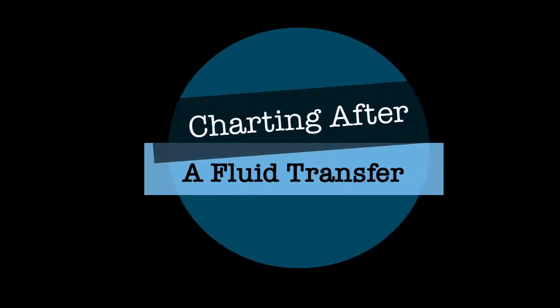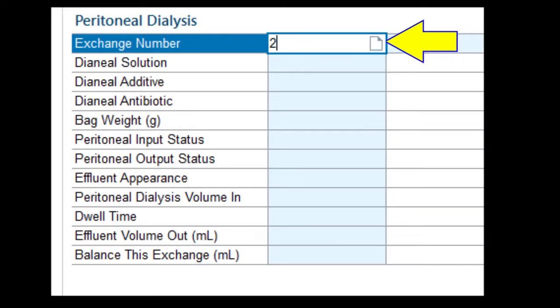With our flow sheet set up, we can now chart regarding our fluid transfer. The first field is exchange number, which is another term for fluid transfer. This is the total number of transfers the patient has had this day. So, if they've come in from home and they already completed a transfer at home before coming to the hospital, the first transfer in the hospital would be number 2 for today.